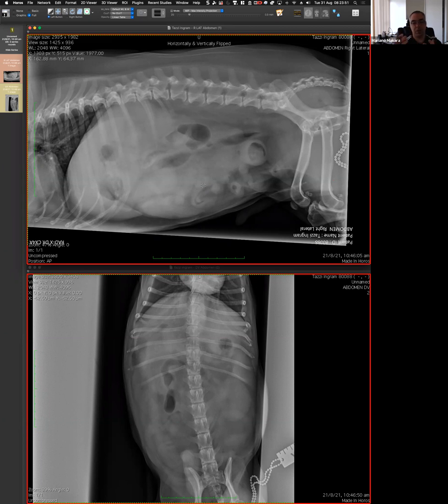The second point that I will make is the diameter. So how are you going to use the diameter to decide one way or the other? I like it. So I think we should go ahead with the idea that that's bowel. Now I'm interested in how certain you are if that's colon or small bowel, because that is going to guide us to go forward. I like that consideration. Is this small bowel or colon? How certain are we that this is small bowel?